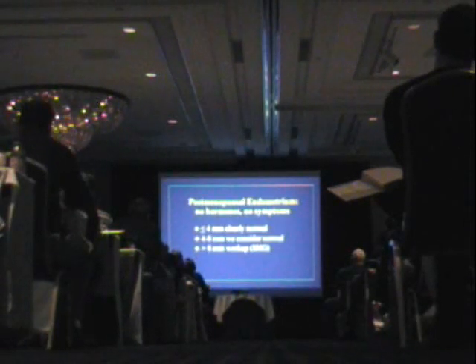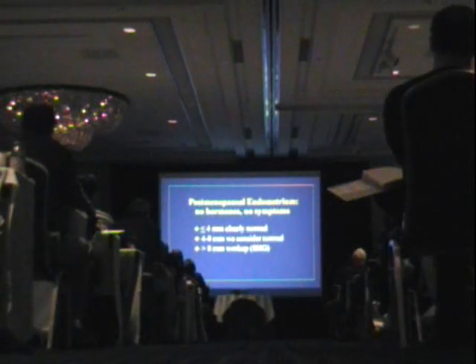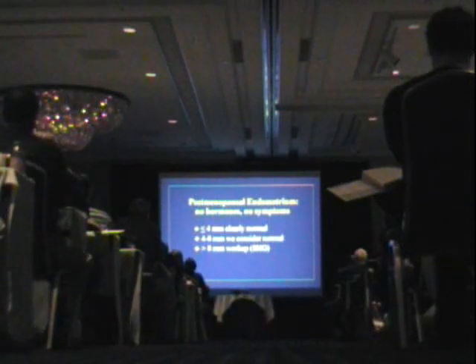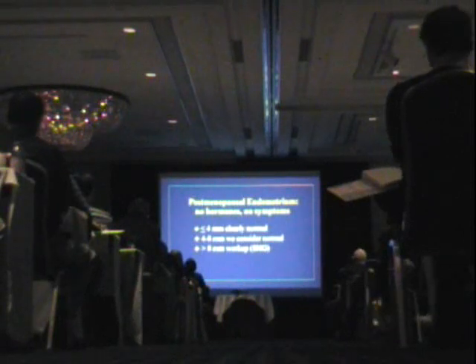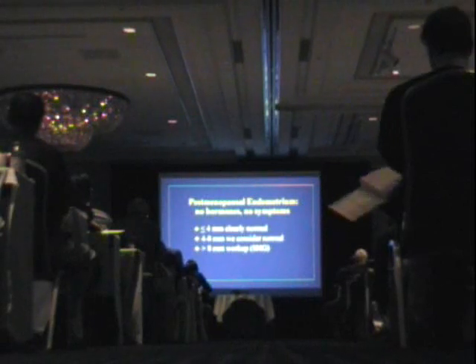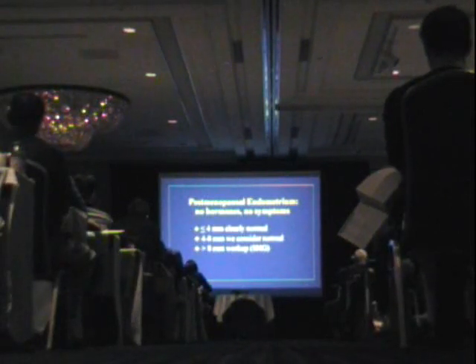A few minutes now on the thing that I get the most questions on whenever I speak about the uterus: what's a normal endometrial stripe? Well, a normal endometrial stripe in a premenopausal patient very much depends on the stage of the cycle, as I just showed, but should typically be under 14 millimeters, anywhere from 1 to 14 millimeters. The premenopausal patient doesn't seem to be where the issues arise. It's the postmenopausal patient that everybody needs to know, so that they're falling into line with standard of care in terms of what's considered normal and what's considered abnormal.